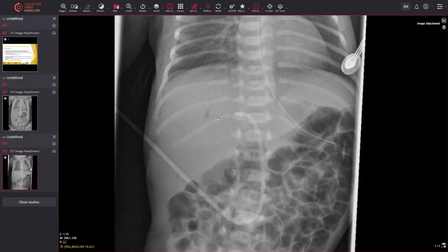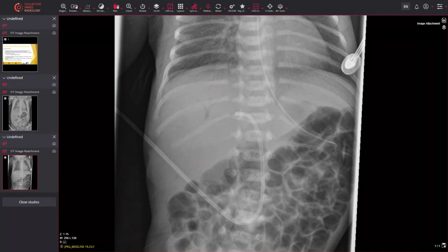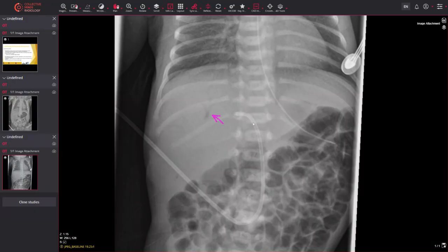If we look, we can also see, as a secondary little complication, these lucencies here. This is gas in the portal vein. This is due to the catheter insertion rather than any serious pathology, which it's normally associated with. But obviously, if you're introducing something external into a bloodstream, there's potential to introduce air there. So that's just a secondary thing to look for with UVC insertion.